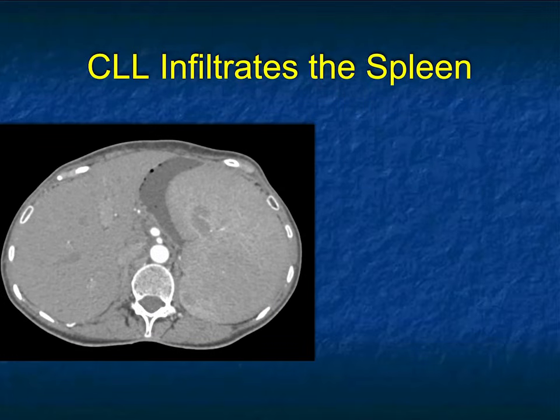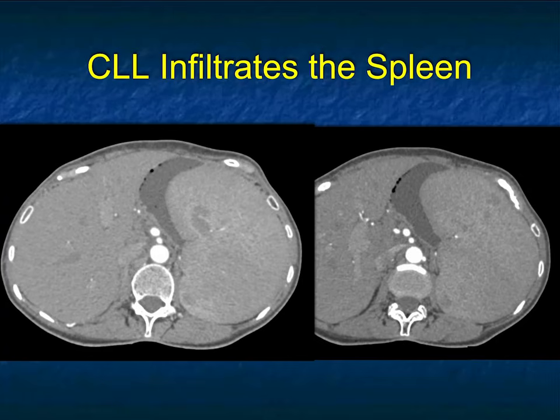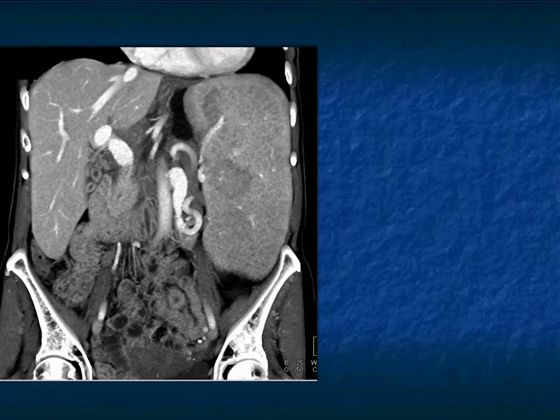I showed you this case of splenic infiltration, and I asked you what else could this be? Lymphoma, leukemia, myeloproliferative disease are all good. Things like mononucleosis are possibilities. Things like thalassemia are possibilities. Things with very large spleens could be malignant or can be benign. One of the challenges, of course, when you have very large spleens like this is spontaneous bleeding.